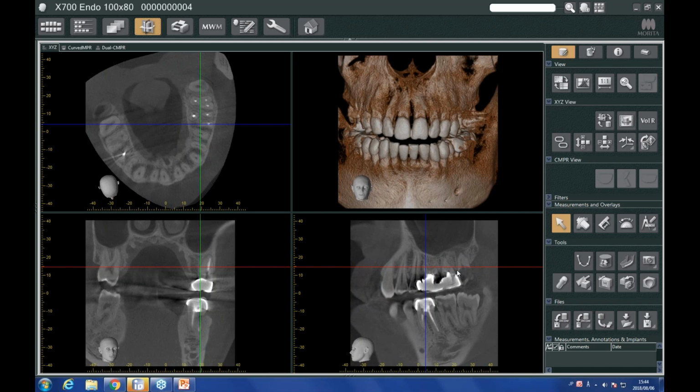Of course, here as well, we see a massive caries. Whether this tooth is savable or not is debatable. I would imagine not. But nonetheless, we will again go back to that. But let's take a look at the rest of this part of the maxilla and see if there's anything else that pops out to us. Again, this is just my quick initial overview.